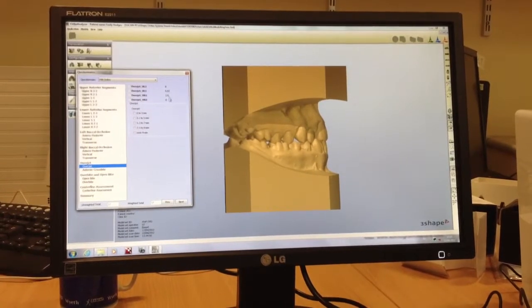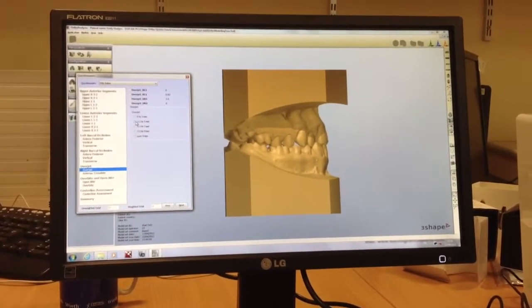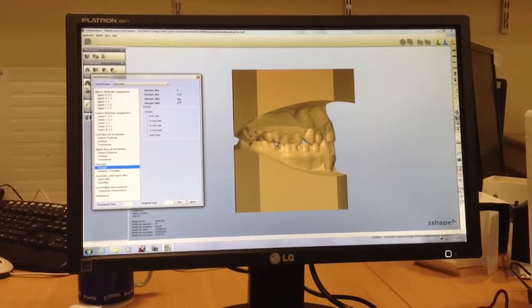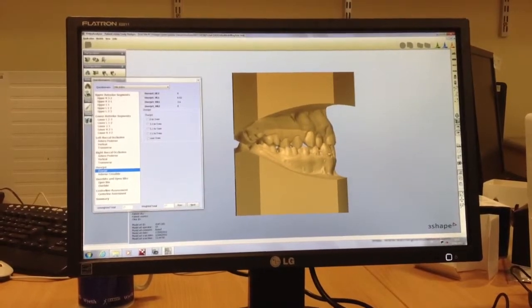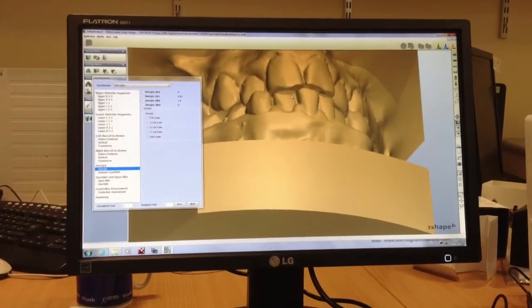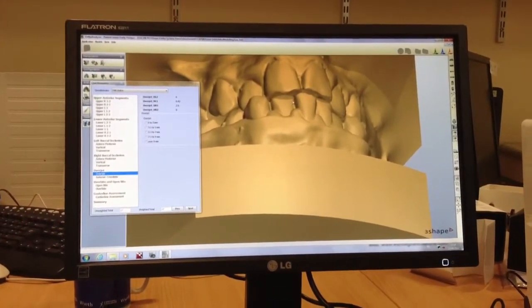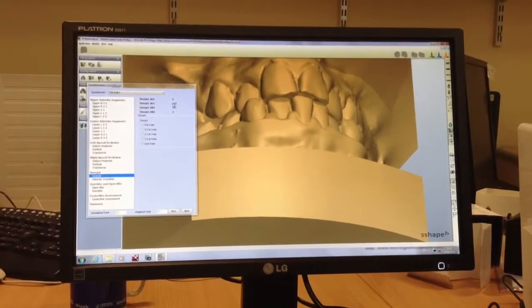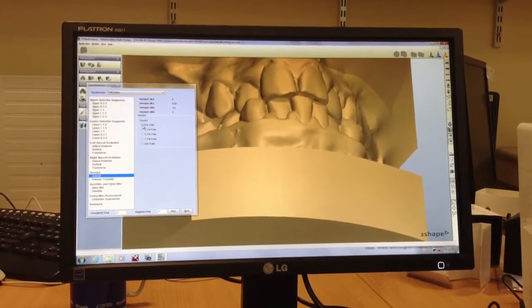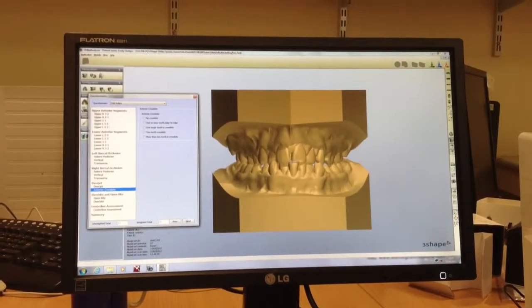Overjet, then the values we've measured at the 2 different incisors are presented here. It's up to yourself which one you're going to go with. It doesn't make a difference, but 2.6 is the distance from that point there to that point there, which is a real overjet, but it's not something that you would measure with a ruler. So maybe 0.82. Anyway, they both fall within the category of 0 to 3, so it's not a consideration.